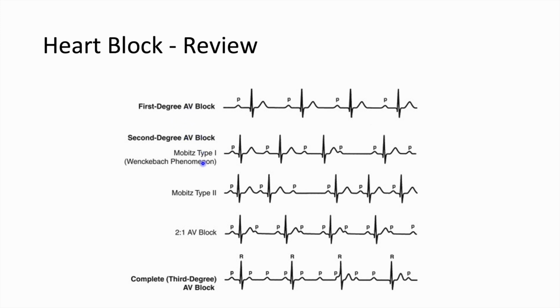So these are AV blocks. And so going, going, gone, Mobitz type 1. Mobitz type 2, normal PR interval, suddenly no contraction after the P wave. Normal, normal, normal. And so you just see normal PR, but a random or sudden drop. And then you have your 2-to-1 block, which can't really technically be placed into either one of these. We see PR and then drop after P wave. P contraction, P drop, P contraction, P drop.